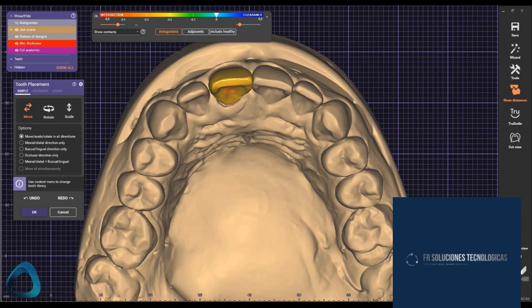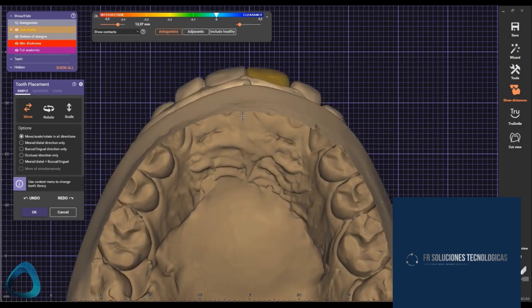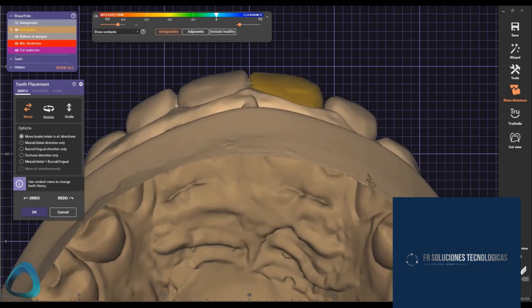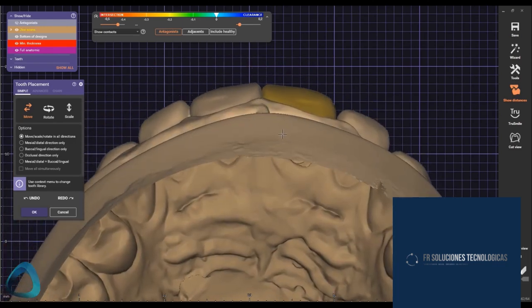Now I click again with the right mouse button and select Show this view opposite side. Then I rotate it until I can see the buccal volume from the anterior teeth. If you want the model to rotate on a straight axis, hold the pointer between the frontal teeth and drag it down. Now add another custom view and rename it.